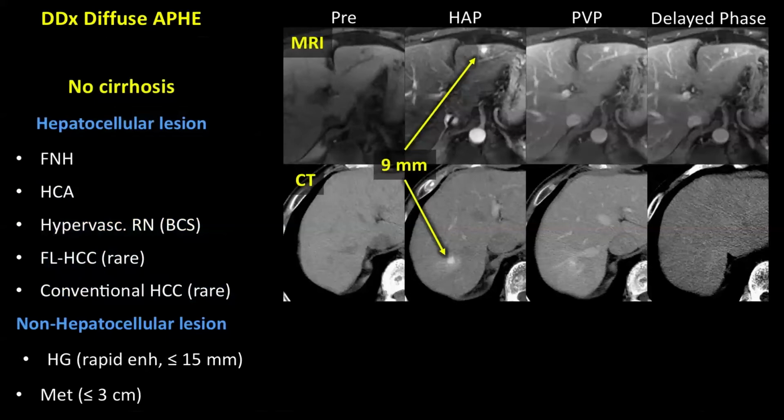How about on CT? Well, here we see arterial phase hyperenhancement, but notice that this lesion fades to isoattenuation. So now I know some of you are probably confused because this hemangioma holds on to contrast and this hemangioma fades. So why is this hemangioma fading? Well, the reason it's fading is that notice that blood vessels fade. So because CT is less sensitive to iodine than MRI is to gadolinium, the blood vessels themselves fade. Where are the blood vessels here? The blood vessels have faded to isoattenuation.